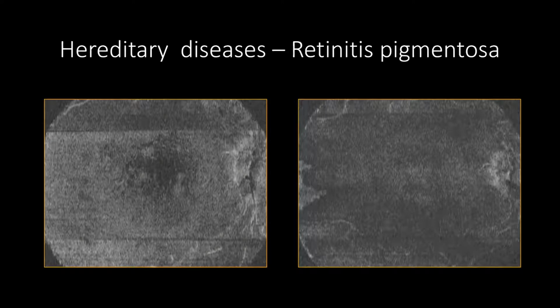Enface provides a pan view of cystic changes and their location in the posterior pole, helping follow up post-treatment. As shown here, in this case showing IPL-INL slab pre-treatment showing hyporeflective cystic changes and post-treatment with oral acetazolamide showing resolution of the hyporeflective cysts.